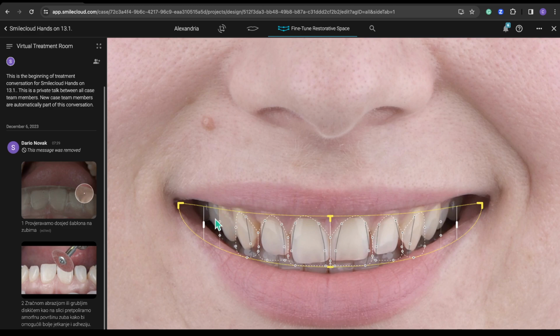If you want to asymmetrically move just one side, you can do it. Moving one side on Mac is done by pressing the Option key. When you press the Option key, as you can see, I'm moving only one side. So this tool allows us to have an asymmetrical design. It's important because very rarely do we have a symmetrical patient. We just need to add composite.